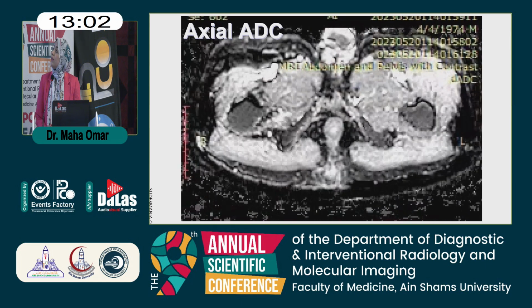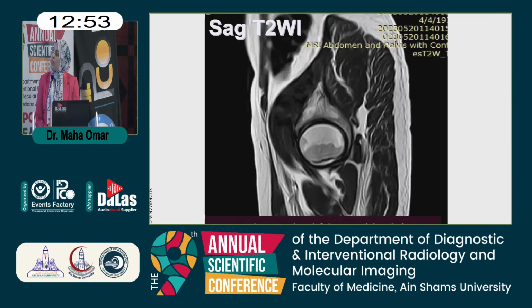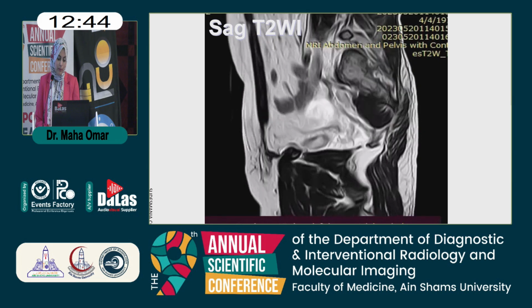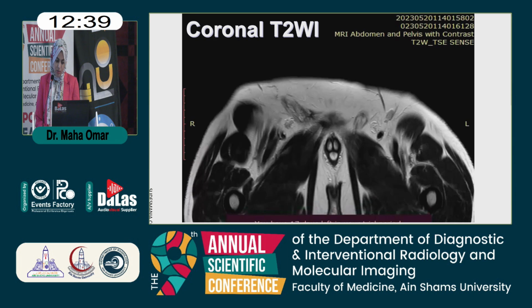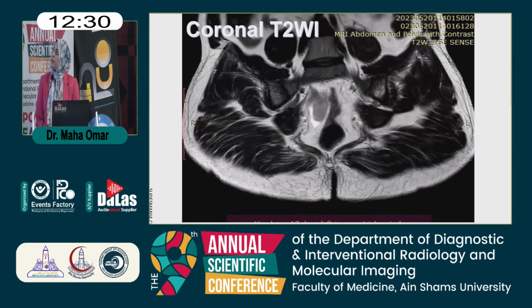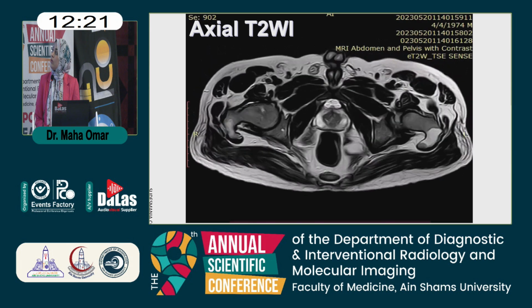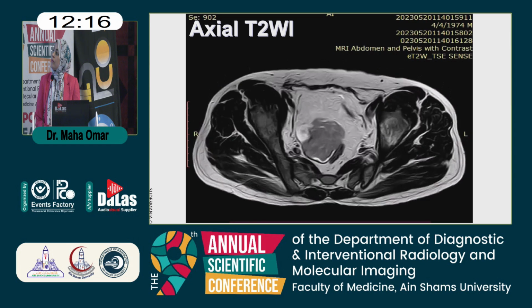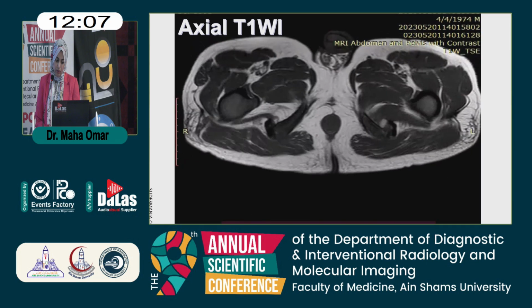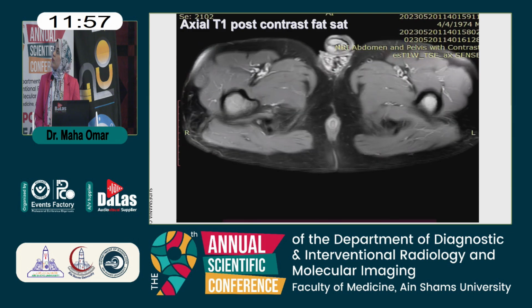The ADC images, the sagittal T2 images, coronal T2 images, axial T2, axial T1 pre-contrast, and axial T1 post-contrast fat-sat images.